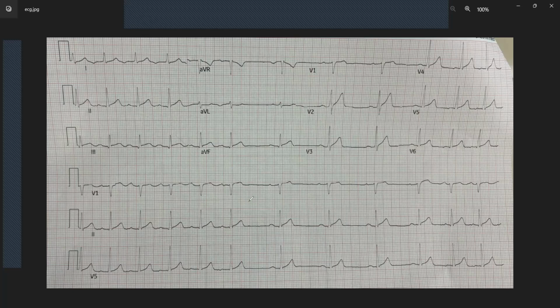So this could well be a rhythm disturbance, a Mobitz type 1, so you could well have a problem with that. So what could be the reasons for that? That's what we need to look at now. So in his case, let's have a look at each.